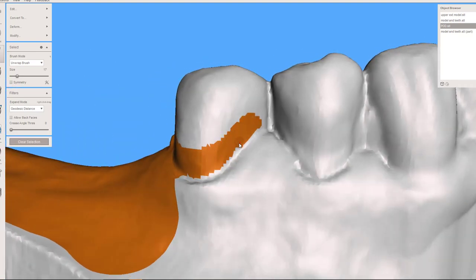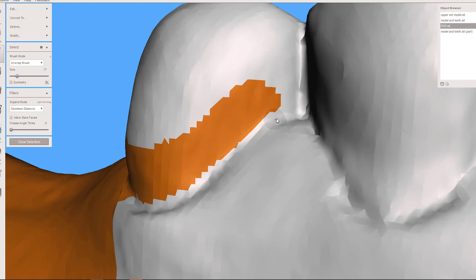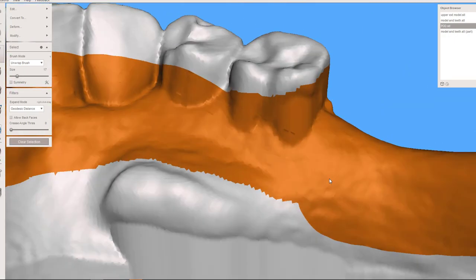Again, I've not done enough of these clinically of designing on my own to really give you tons of feedback on the ideal parameters. That's for you to figure out after you do a few of these, because I'm not seeing patients anymore. All right, that looks pretty good.